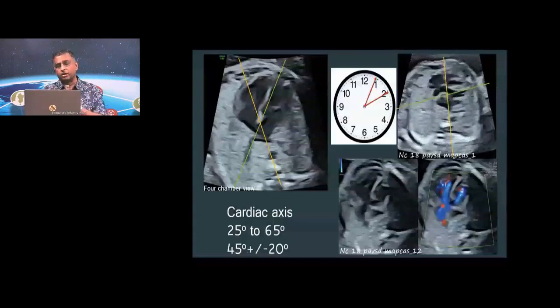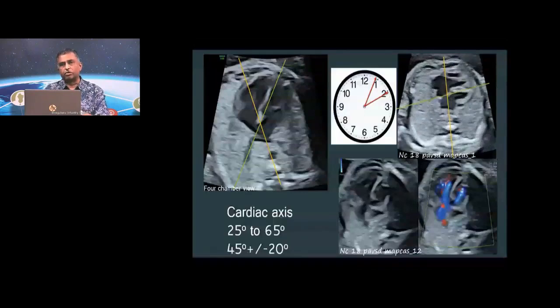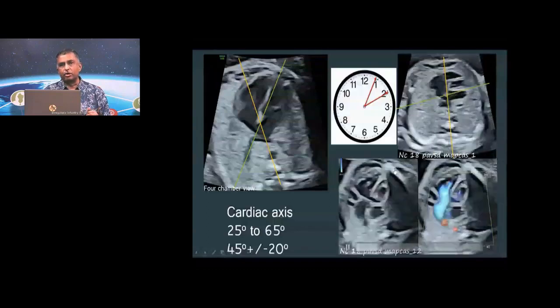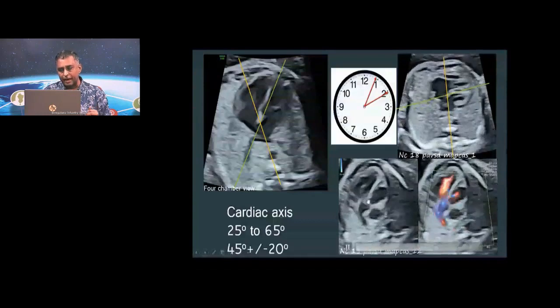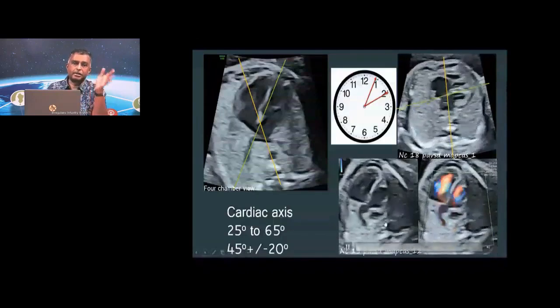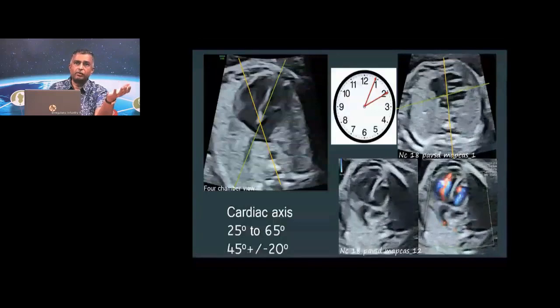And why are we looking at this? This is again a very strong marker of conotruncal abnormalities, of outflow tract abnormalities. Now, in the same case, when I show you the LVOT, you will realize that there is a malalignment VSD over here, overriding of the aorta, and the pulmonary artery in this particular case was narrow, and that's a tetralogy of Fallot that you're dealing with.